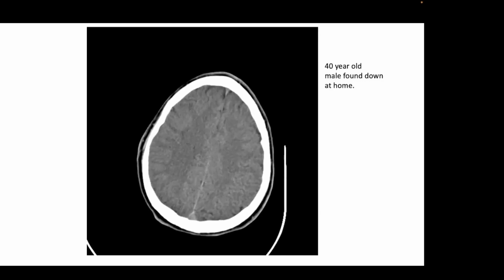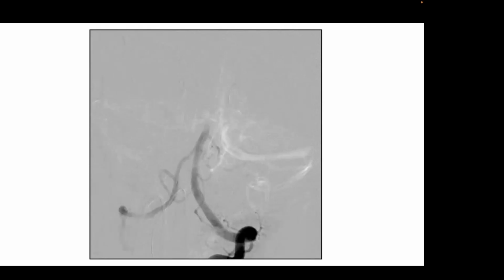Now these patients, there's some controversy about what to do next, depending on, in this case, the time of the occlusion was known. And so the patient went directly to angiography. This is the angiogram, which shows you the flow in the injected vertebral artery. Here we have the V3 segment, V4 segment, confluence with the other side.